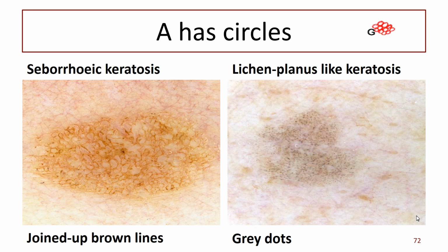Do you have a question? Just what is the white? I see no white. In this one? On the one on the left. The one on the left. No white. Skin coloured? Bubbles. Okay. They're bubbles. They're exactly that.